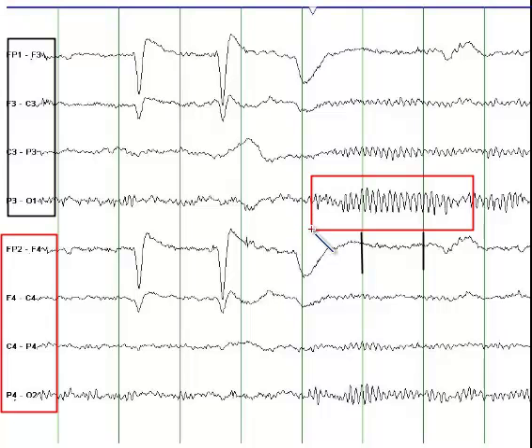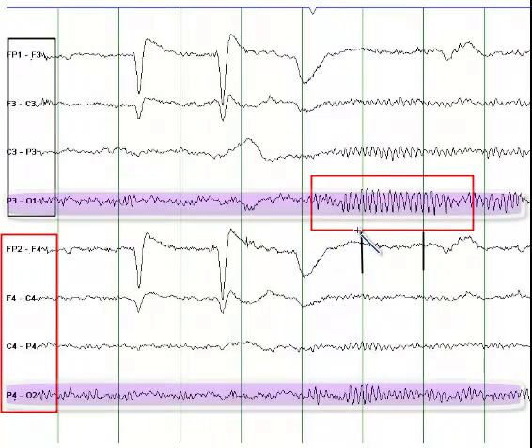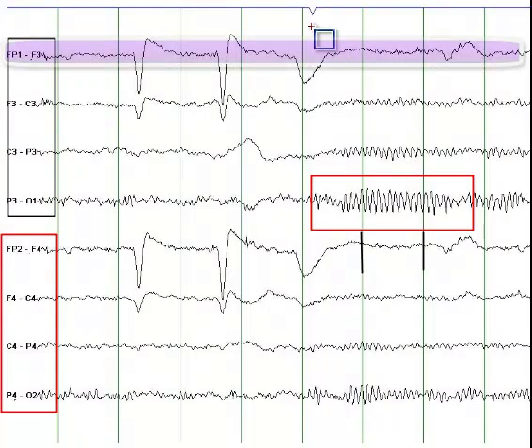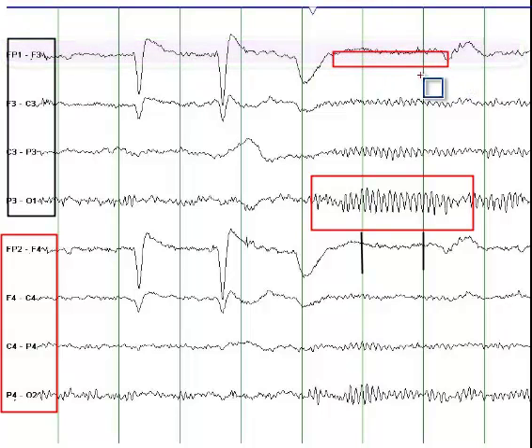In normal adult individuals, alpha frequency is predominantly seen in the posterior part of the brain. If you look on the anterior head region, so let me draw another square here. If you look in this area here, this is beta frequency, so it's a fast frequency.